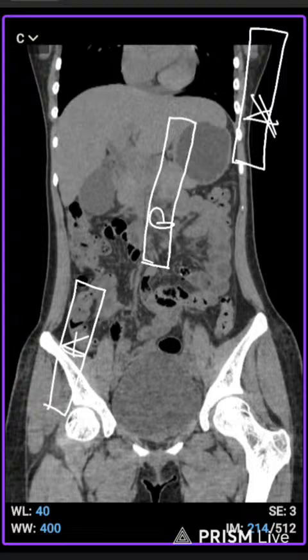In between, the arterial scan happens 4 seconds after the locator receives a high Hounsfield unit. The locator detects that contrast is coming into the artery. After 4 seconds the arterial scan will be done.